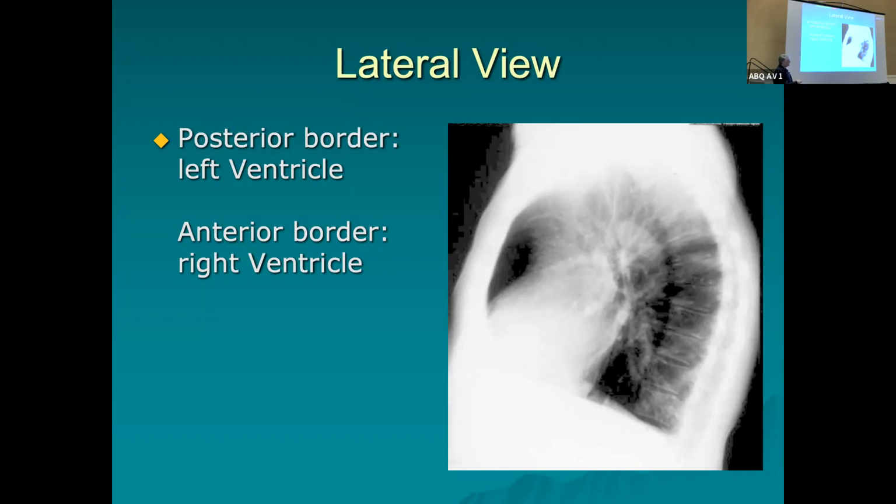But you should be able to see the lung field right back in through here. Now, there is pathology on this one, but it's not in the lungs. If I told you this is an elderly lady, walks around like this, everybody's doing the same thing. They can see that little bitty curve right there. Yeah, she's also got little compression fractures right through there.